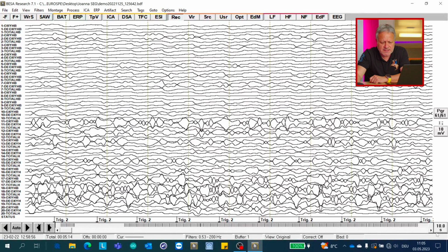Watch this. Here it says 10 seconds. We have 10 of these: 1, 2, 3, 4, 5, 6, 7, 8, 9, 10 divisions. One division is 1 second. These trigger marks are around 1 division apart from each other. So there again, the 1 second triggers have been embedded into the NIRS file from the USB receiver, sent over to the trigger input of the light NIRS, embedded in the file. We have it all together. So we have the light NIRS file beautifully synchronized with the 1-second triggers.